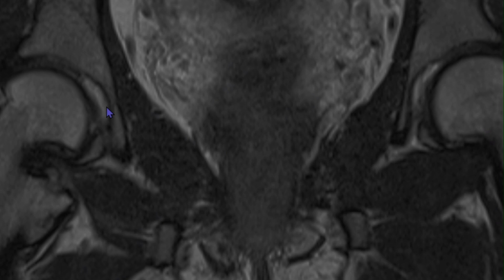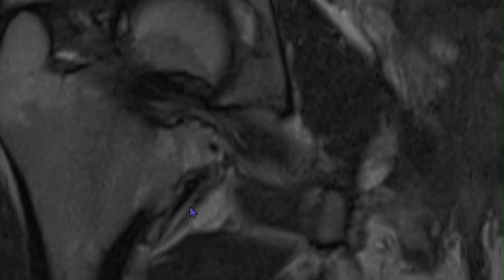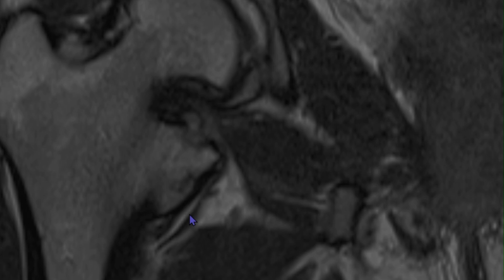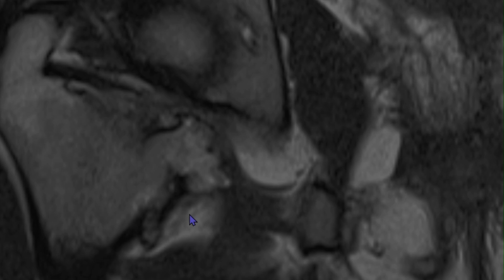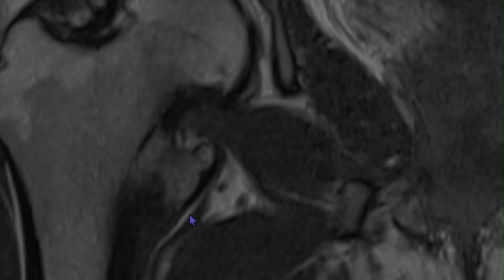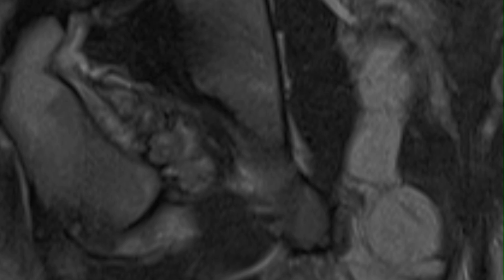I'll show the zoomed out version of this, and here we are able to see the bizarre shape that it takes. Osteochondromas usually take these shapes. The things that cause concern in cases of osteochondroma are increase in size, development of pain, increase in the cartilage cap thickness, usually more than 2 centimeters when measured along the axis of the growth, then any edema, or any bursal formation, that is pseudobursa formation because of friction. And most of the time it is not the lesion itself which is the cause of pain, like in this case, but its location.